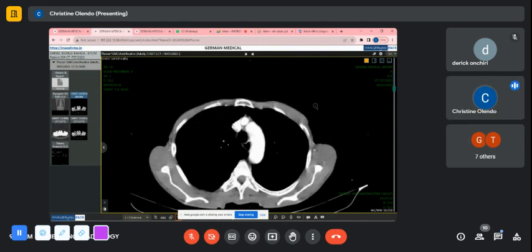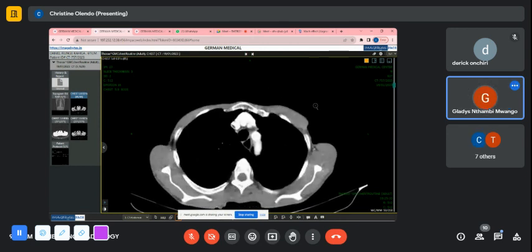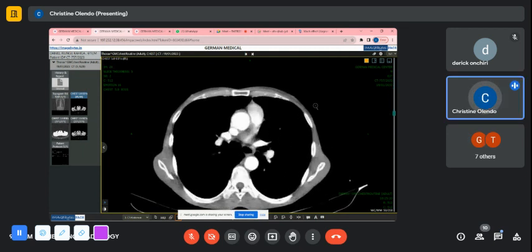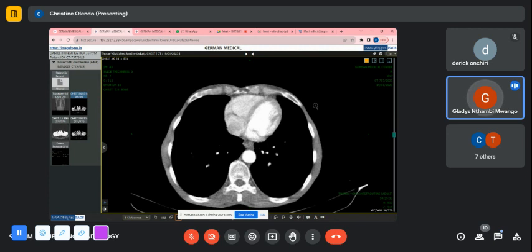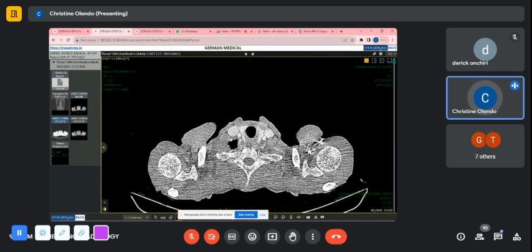Yes. I guess that's why they didn't really bother about it because he has bigger problems when you go down. Yes. Yeah, and the main thing I think they were looking for in that particular window were mets. Mets, yeah. And all that we saw was just so. Where is the esophageal mass? Esophageal mass. This area. Yeah. Okay. So it's markedly thickened. Okay. Yes. Right. Yeah. Sorry. The question was just to confirm if that was the mass that I was seeing, or maybe I'm just forcing it.